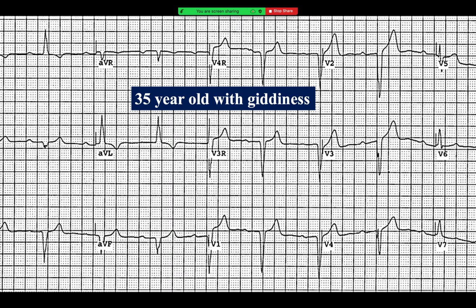What about this guy? 35-year-old female with giddiness. Come on, use the chat box. You know the diagnosis very well. There is left axis deviation.